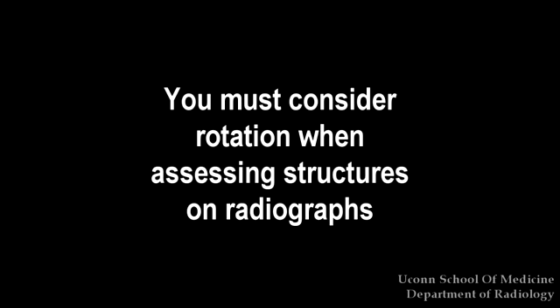Rotation. When an X-ray is taken, the patient's coronal axis should be as perpendicular to the X-ray beam as possible. If they're not perpendicular to each other, the patient is said to be rotated, which produces a technically inadequate film. Let's demonstrate the concept of rotation.